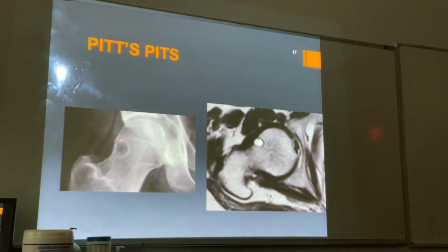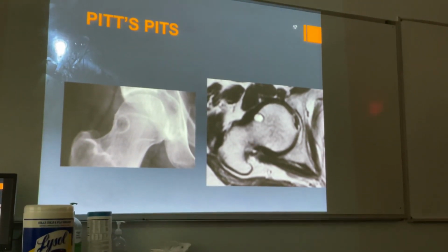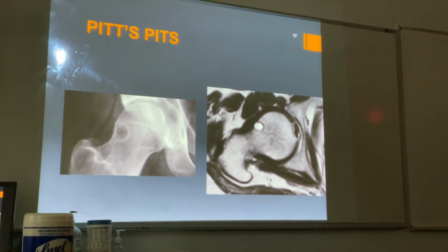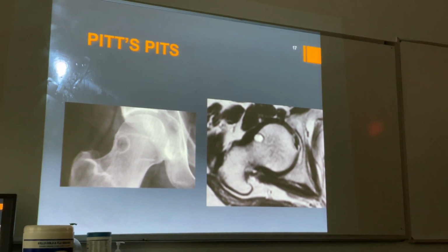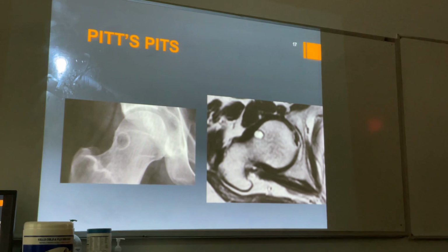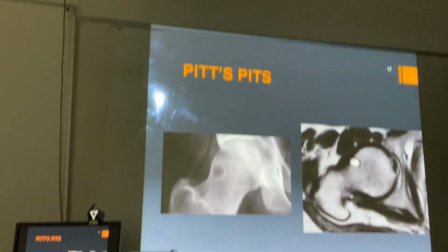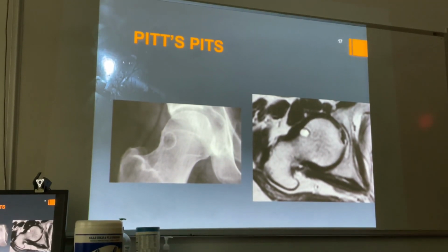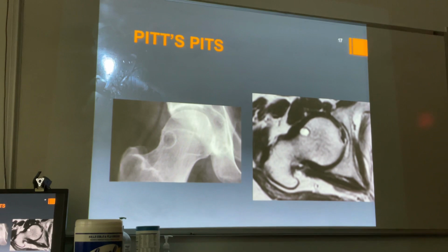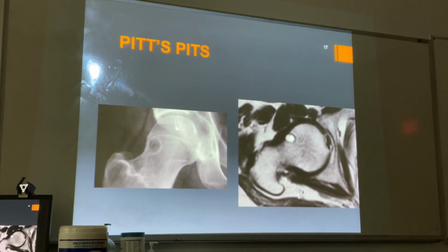Now you would think, this being as close as it is to the cortex, it should undergo pathologic fracture, but it doesn't, for whatever reason. It's more likely that the little old lady or the little old man steps off the curb, sharp pain, and they fracture because they have lost bone density. These fibrous conversion defects are generally inert, not a big deal. But what this does show is what a normal capsular line should look like.